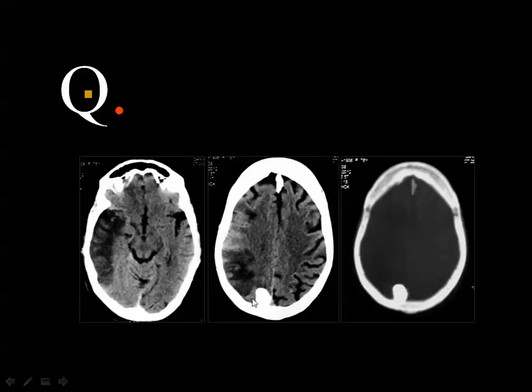Axial CT without contrast, soft tissue and bone window. Showing calcified lesion adherent to the inner table of the skull and a hypodense lesion in the temporal area on the right side. And this is bone. This is infarction, okay. And then this infarction does not exert a significant mass effect. It may be a subacute infarction.